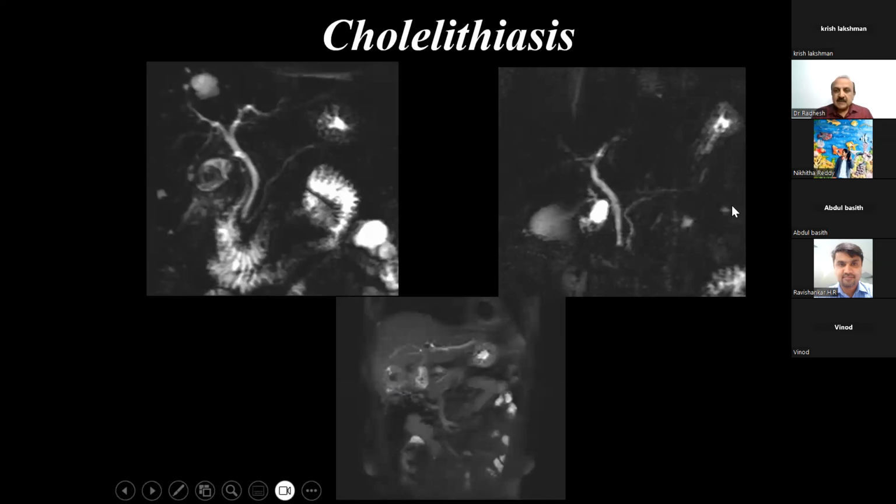Now this is again a 3D MRCP image, and in this 3D MRCP image, you don't see the calculus at all. Here it's a thin MIP, a thin maximum intensity projection, meaning we have fused around 10 or 15 slices, though we acquire 50 or 60. But when you fuse everything, you see the additional fluid coming here, and then you don't see the calculus at all.